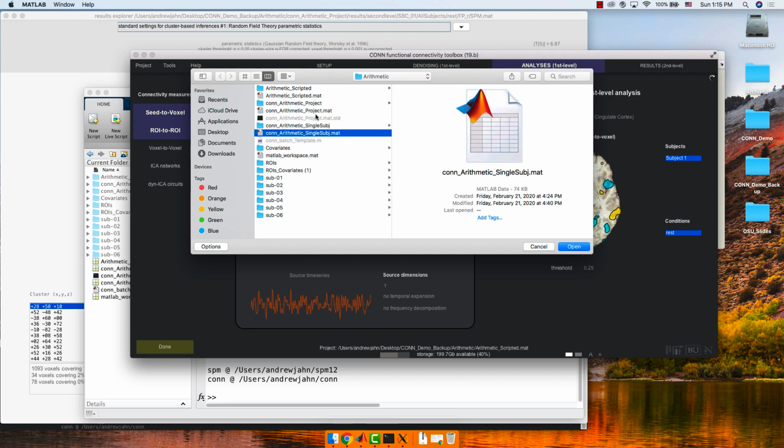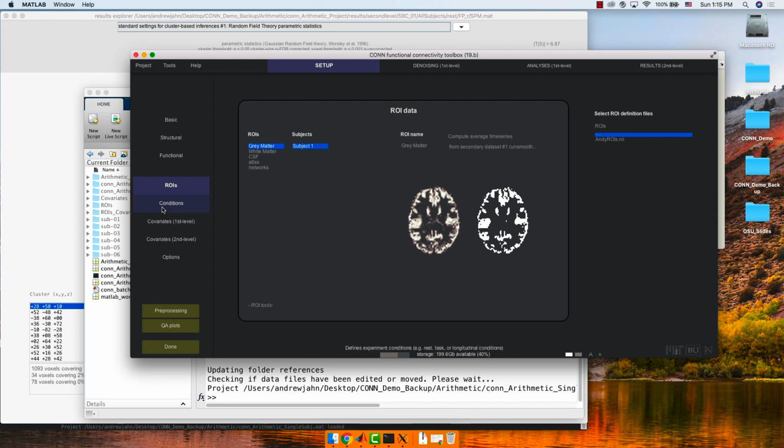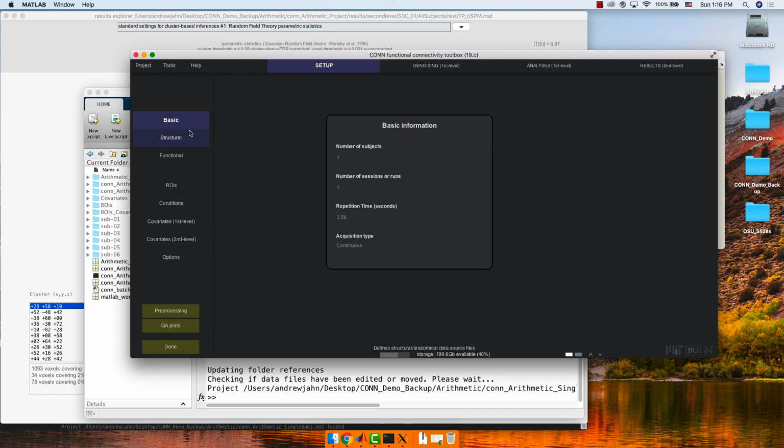So I believe it was, I think it was this one. Yes. So the lucky ones who got everything from the hard drive might also have this as well. So let me back up and show you exactly what happened here. Within the OpenNeuro data set, in addition to resting state scans, they also have some task-related scans. They have two conditions. They have a math condition and a control condition. I don't know the details. Maybe they just saw numbers or something. I don't know. Something like that.